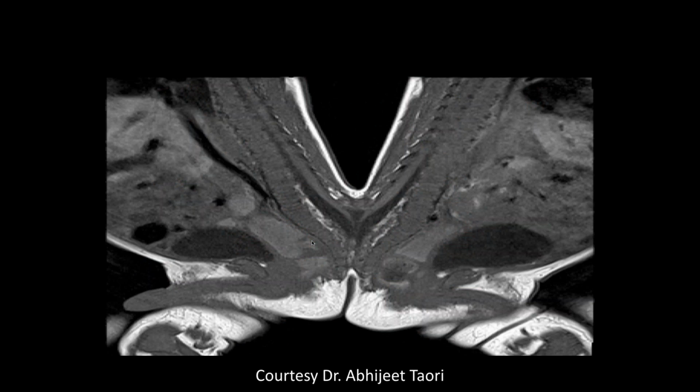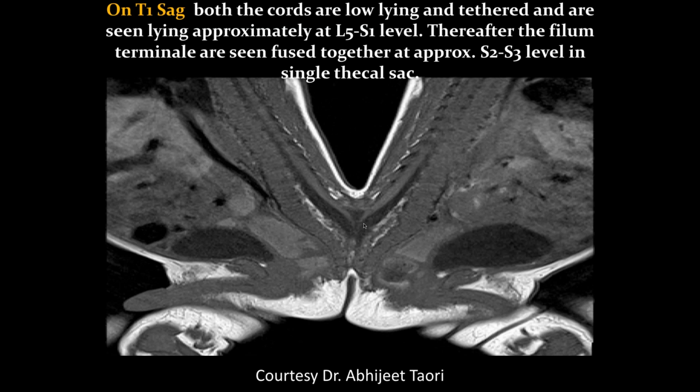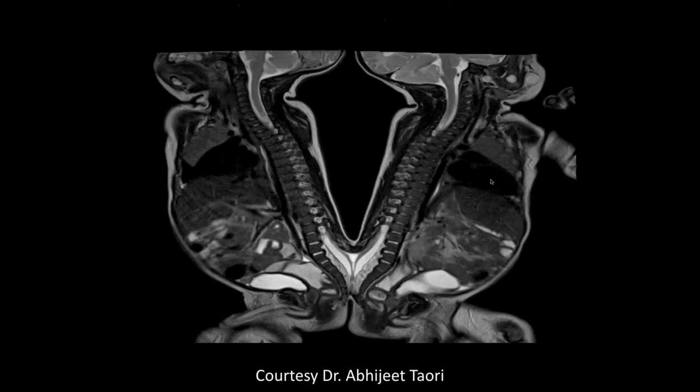MR. This, yeah, so it looks like this is a T1, I guess. The fluid of the canal looks like it fuses most inferiorly. So I don't know that the cord is going to be higher, I guess. It looks pretty separate until you get down to the sacral area where you see some fusion with the nerve elements.